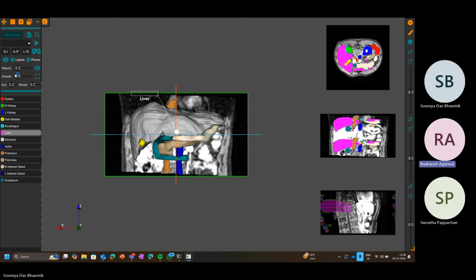Here the structure has become very coarse, and you can see a lot of details which are not needed and not anatomically true. Whereas if you smooth it to 1, the structure has become too smooth and a lot of fine-grained things have gone. So smoothness set to 0.5 is enough.